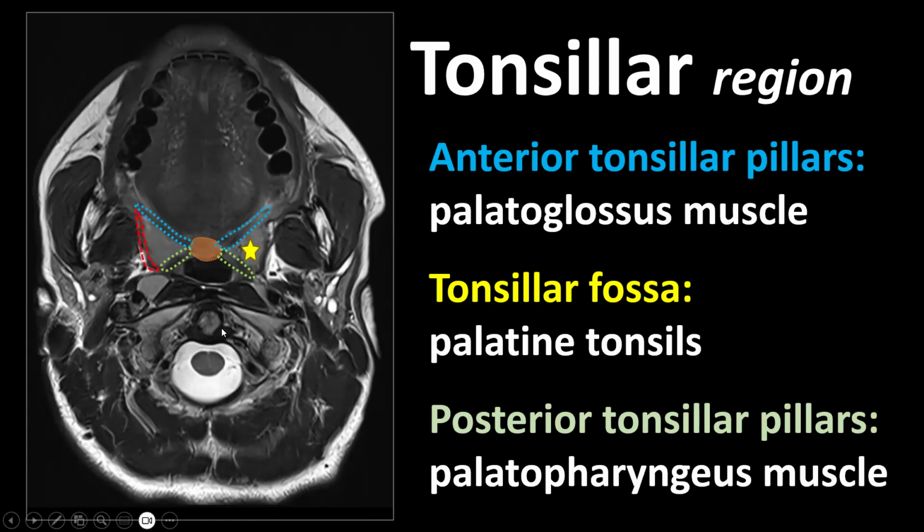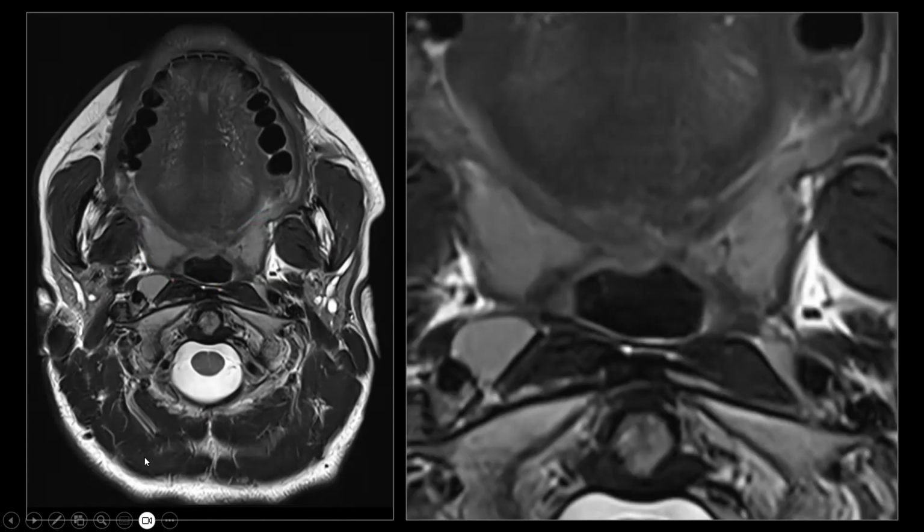Then we have this muscle over here lining the lateral part of the palatine tonsil. What muscle is that? This is the superior, depending on the level you're looking at, could also be the middle, but probably the superior constrictor muscle over here. And the superior constrictor muscle not only forms the lateral wall of the tonsillar fossa, but also runs in the posterior pharyngeal wall. So this is the superior and or middle constrictor muscle. I magnified this a bit to make it even more clear.